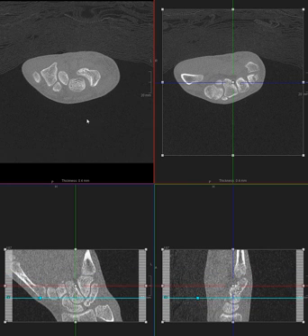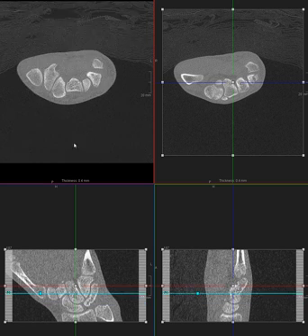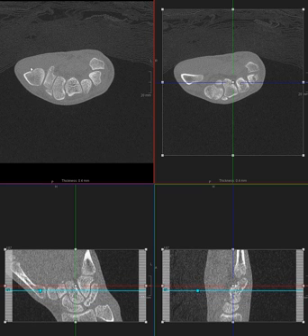Usually it's some oblique plane because the patient's hand position is not perfectly aligned on the table. You get these sort of oblique axial images, which by the way are flipped. We'd prefer these to be so that this side is displayed up here and this side is displayed down here.